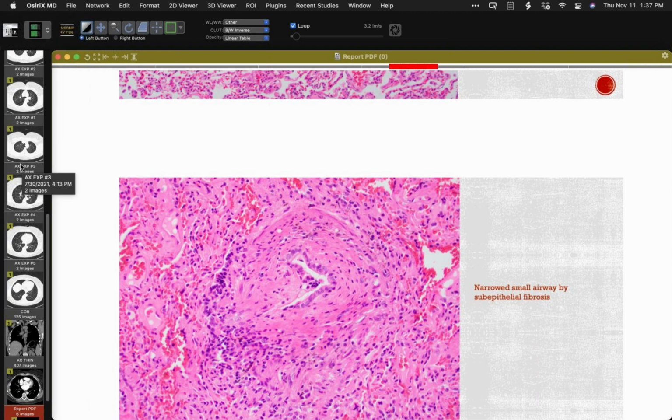Very nice case. Thanks, Howard. Do we have a diagnosis, Howard, of the ILD? Not the cause of it, David. The biopsy will rarely, if ever, show you the cause.